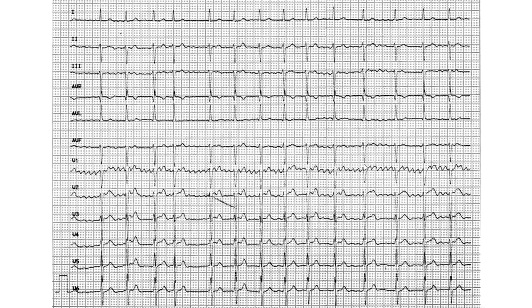Then again, when you hear me in the seminar saying "then again," it is because I say an answer based on what I see. Then I go look at the ECG script and I say, "Oh, the script doesn't agree with me. Let me modify my answer a bit," because I don't know. This isn't very easy, I must say. 1, 2, 3, even because they've apparently answered that it is apparently 3.5. Okay, allow them. Or wait, they said 4, right?